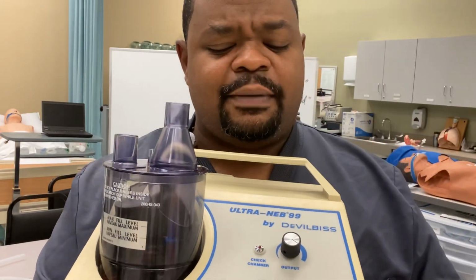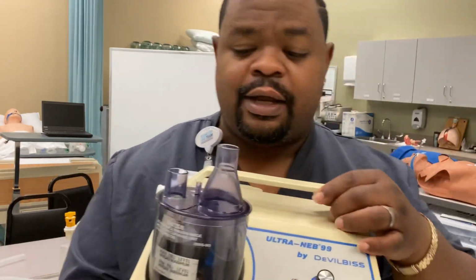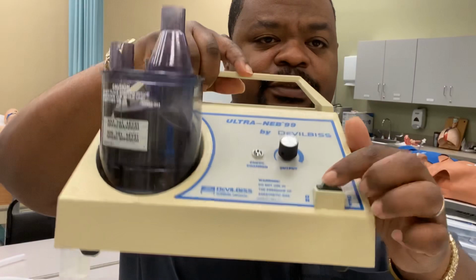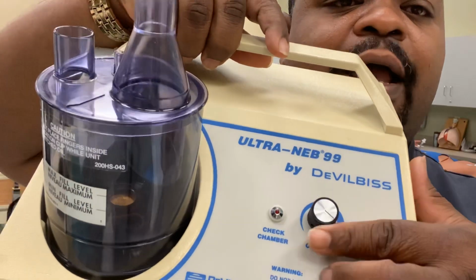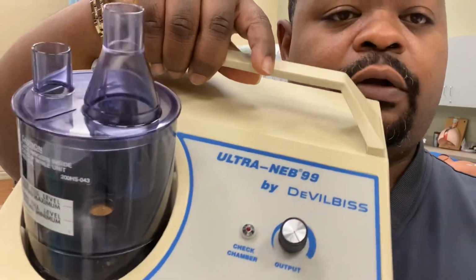I have to look up and see exactly what that means. I forgot. It's not on the tip of my tongue. But the FCC mandates the amount of frequency that is delivered in this piezoelectric crystal. This piezoelectric disc turns water particles into smaller ones, and it does so well that the government has to regulate it. So we have it here as your on and off switch, of course. And also here is what's called the output. This here is your output. I can make it fewer particles or I can make it a whole lot of particles.